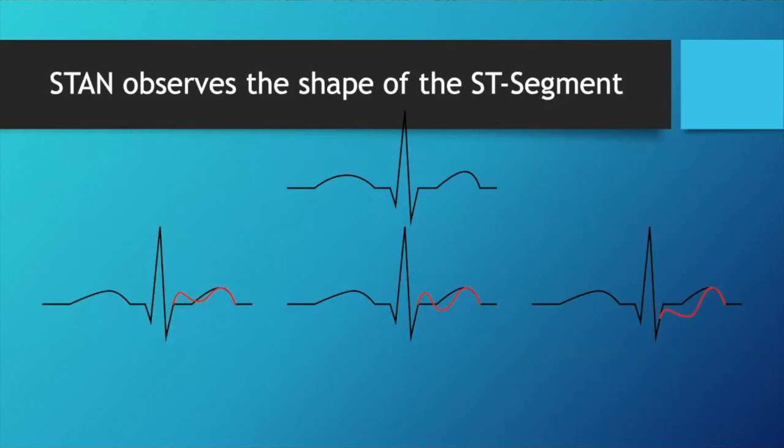So as I said, it's comparing two things. One is the ratio, so the QRS-T ratio, and the shape. QRS-T ratio is telling you whether hypoxia is gradually happening, whether there's more glycogen being broken down. The biphasic is telling you whether there's suddenly an acute episode when the pump has suddenly stopped working or is faltering, which is why this is showing.